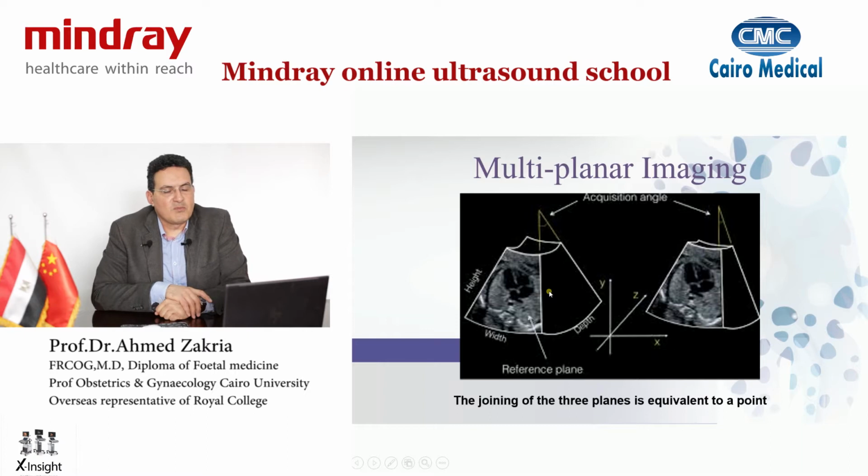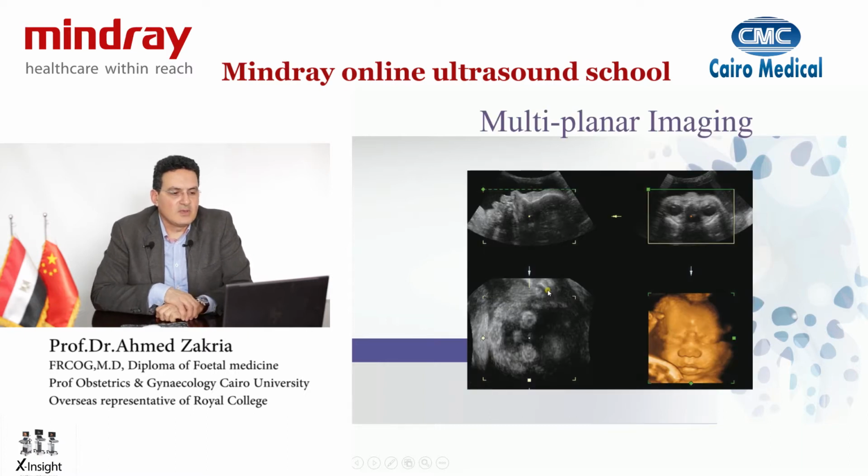Here we have different analyses. The first analysis in the imaging is what we call surface imaging, where you put your volume of 3D parallel to the target of interest, and that volume, that camera of the 3D, will take all the slices across the surface, and you can render all those slices into an image.